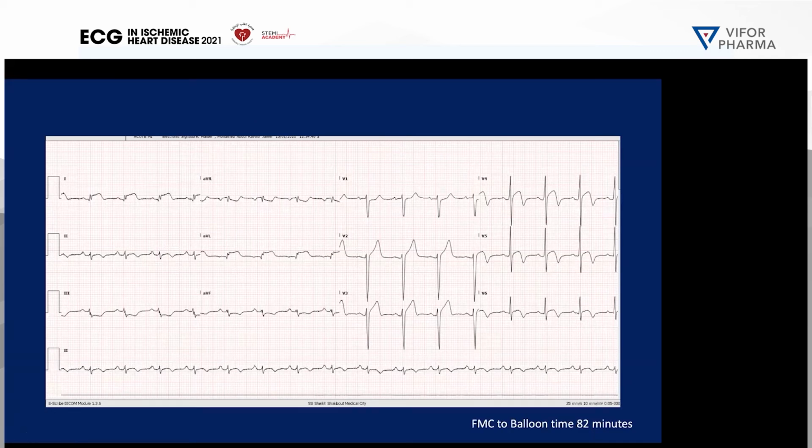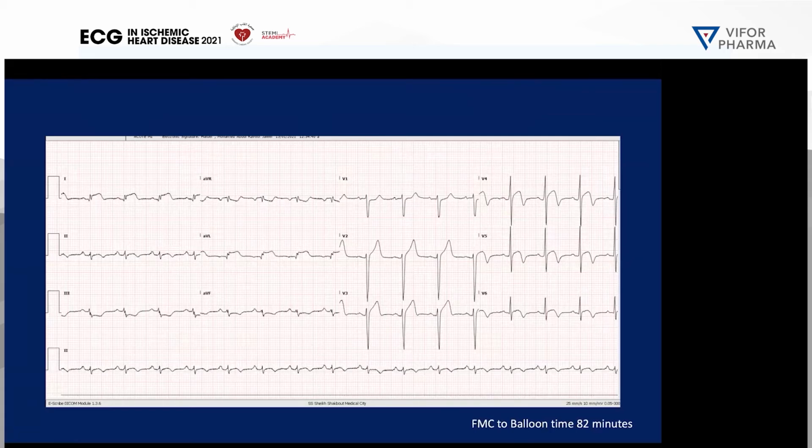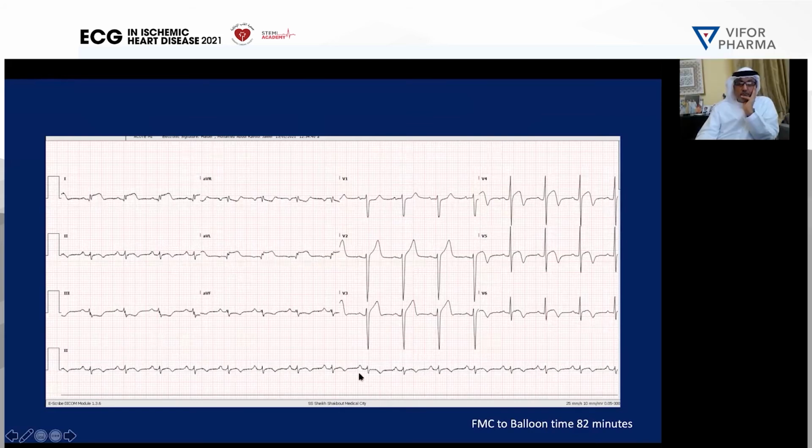Now we'll go to the ST segment. What do you think? Lead 1 and AVL, and from V2 till V5, V6, then in the inferior leads you have ST segment depression. So sinus rhythm, about 100 rate, but the most important is there is ST elevation involving almost all the anterior and lateral leads, from V2 down to V6. The anterior leads are all involved. Then the high lateral leads, lead 1 and AVL, have ST elevation. And then in the inferior leads there is just depression.